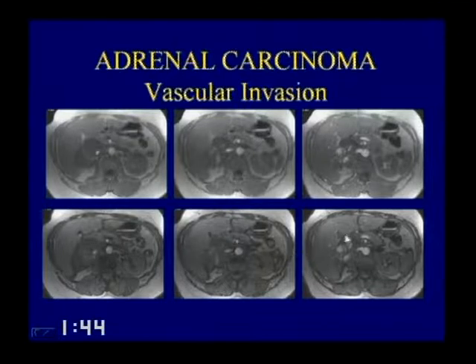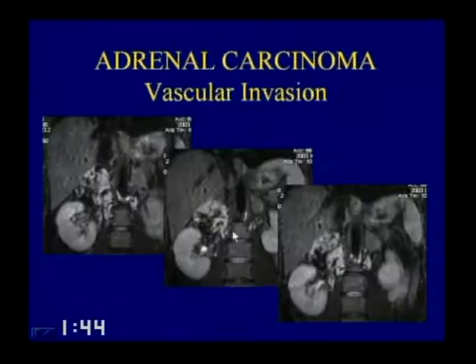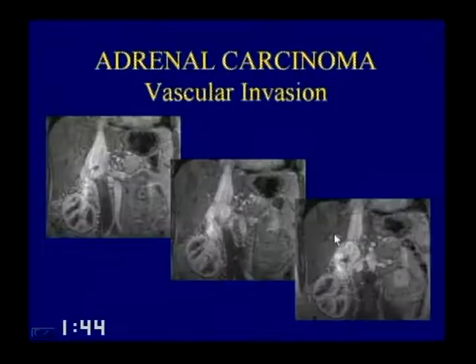Here's the vasculature. Here you can see it on T2 scans, again, clearly separate from the kidney if reviewing the images as a whole. Here you can see some extension toward the IVC. And here the post-infusion scan, really helpful in showing the tumor extension towards the IVC. There was never a slice where you could get it off that IVC, and it was growing into the IVC as seen at surgery.